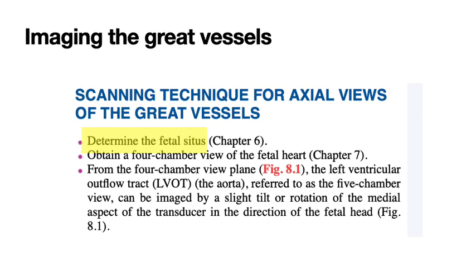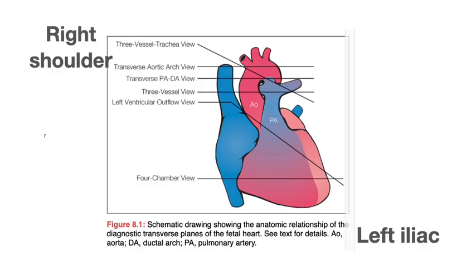I just wanted to put that slide up there to let you know that they keep saying this over and over again. Now, we're going to talk about imaging the great vessels, and we're talking about some specific views that we get. And here they are, just to review.